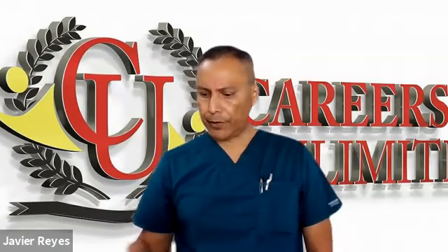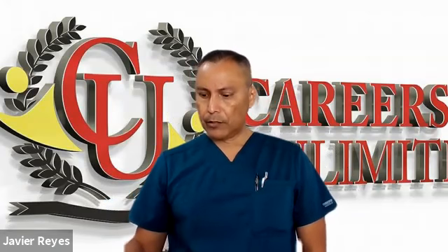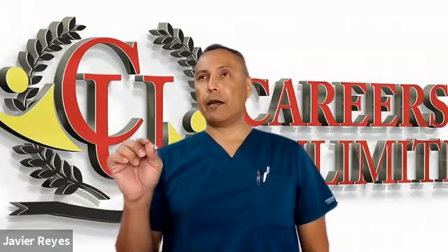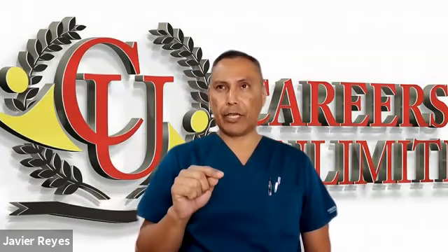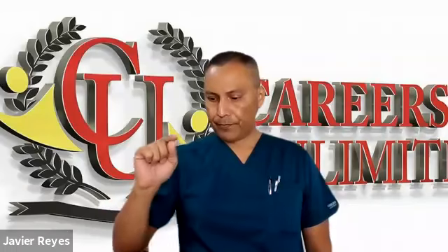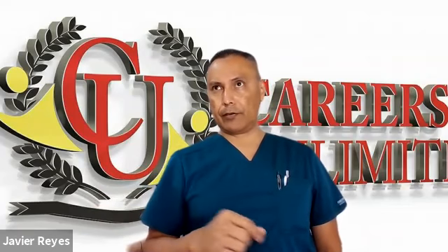So on figure 10.3, bundle branch blocks, letter A is a right bundle branch. So we said earlier, right bundle branch is characterized by an RSR. RSR, meaning you're gonna have one peak going up and then it comes down below the isoelectric line and then it goes back up. Okay, so you see that? Again, this is also sometimes referred to as the rabbit ears.